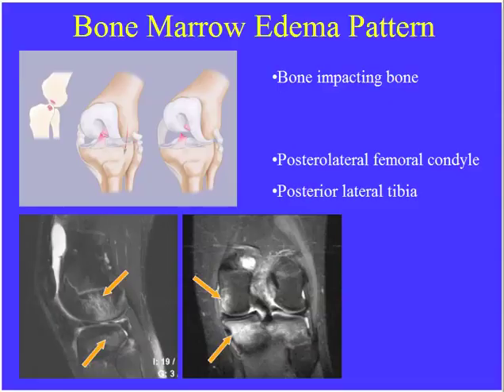They may also show you this example with marrow edema in the posterior lateral femoral condyle, posterior lateral tibial plateau. Arrows are on the wrong side here. This is lateral over here, but this is lateral. The image they're going to show you is going to have lateral femoral condyle marrow edema, lateral tibial plateau marrow edema, occurs secondary to the pivot shift mechanism of injury. When you see this, the answer is anterior cruciate ligament disruption.